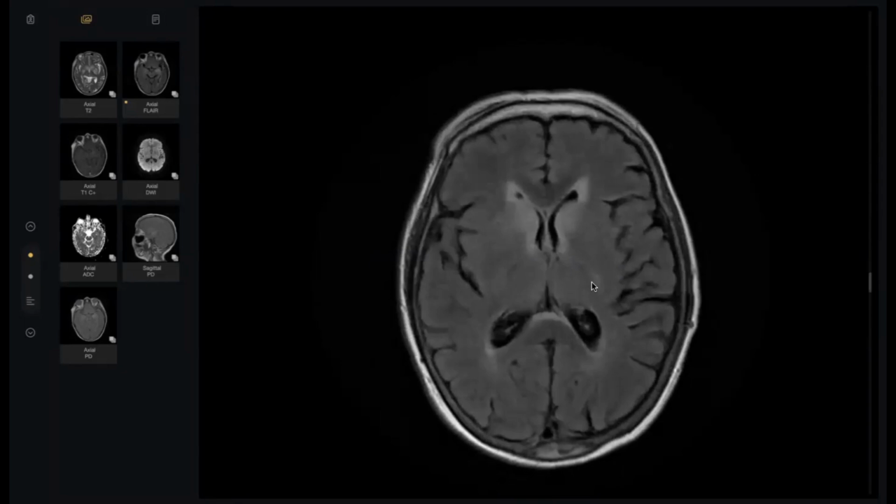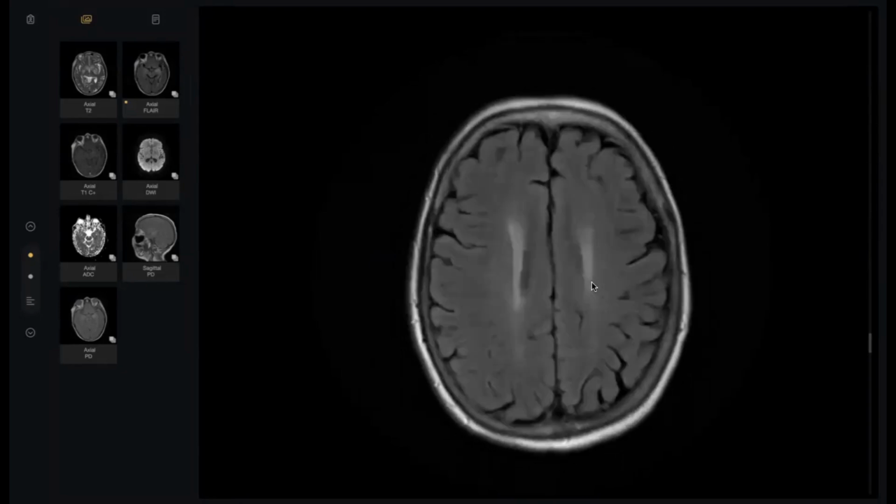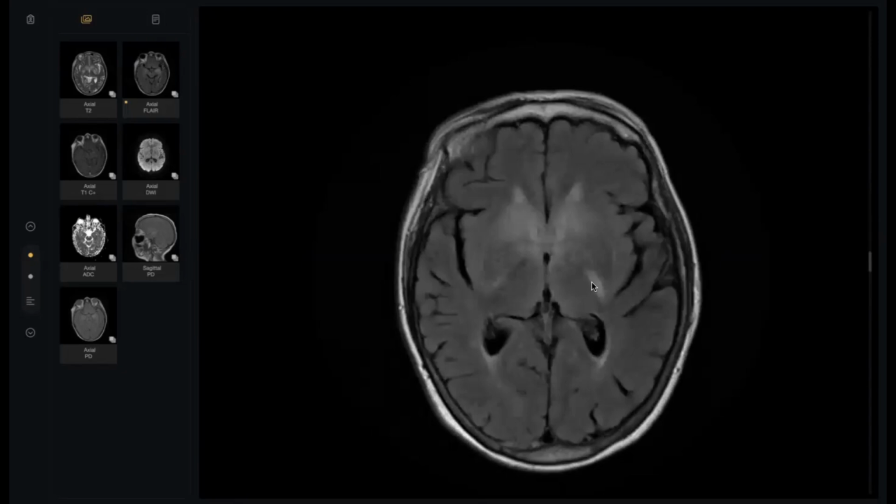In this instance, my differential diagnosis would be gliomatosis cerebri, an infective inflammatory process. Other differentials, given the 65-year-old patient, could be herpes simplex encephalitis. But do you remember the history? Yes, she is complaining of diplopia, eye symptoms. Do you remember the onset? I mentioned the onset.